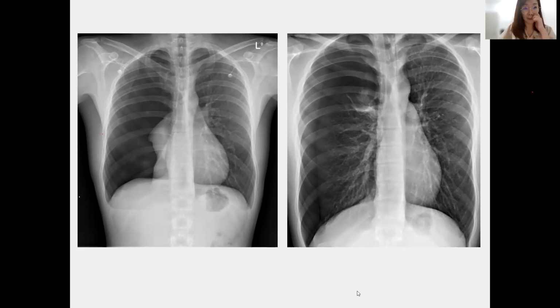Please answer. Okay, anyone? This is an easy one. Pneumothorax. The left side, both sides the same, is it? Yes. But the left side, is it a tension pneumothorax? Cannot say yet, because there's no shifting.